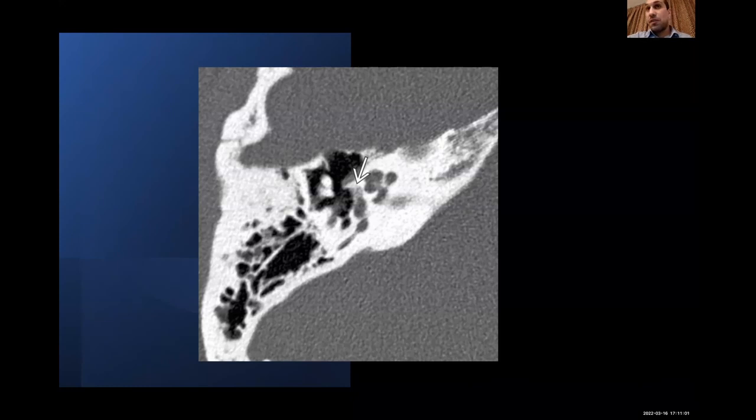Who said sclerosis? Yeah, Rania. Okay, great. This is otosclerosis. This is a misnomer. The true name is otospongiosis, because it presents with lucency. In the beginning, it presents with lucency around the oval and round window, and it is common, especially during and after pregnancy. It is more common in females. It is a misnomer.